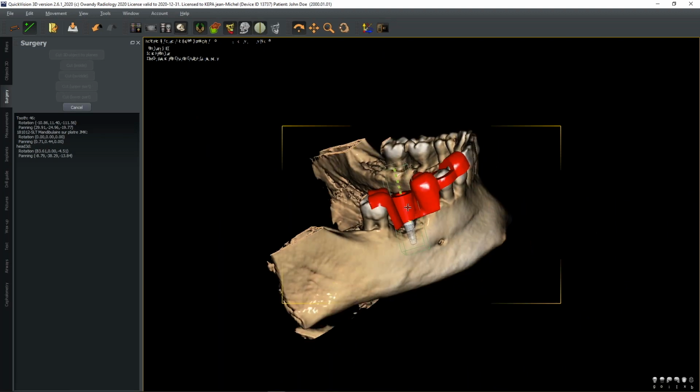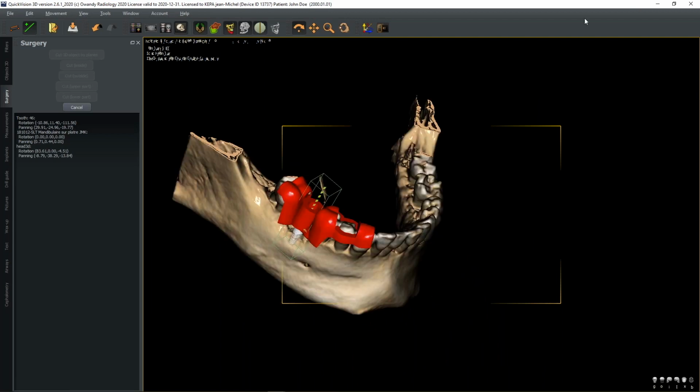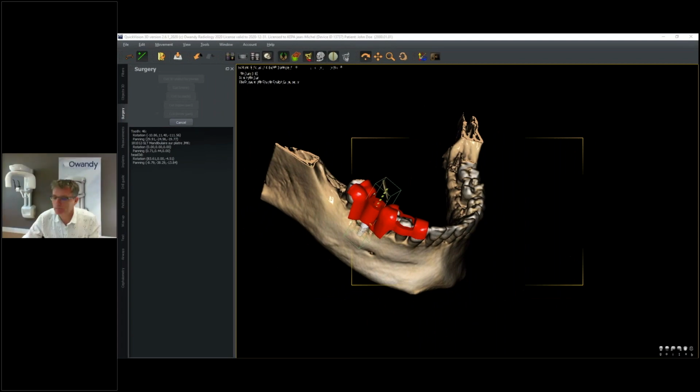Just call back the CBCT. It will be the position of our drill guide. I just call back the camera, Bob.